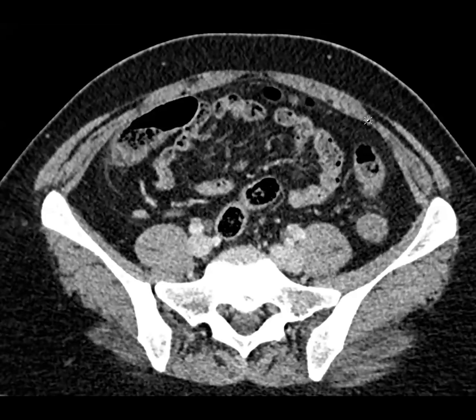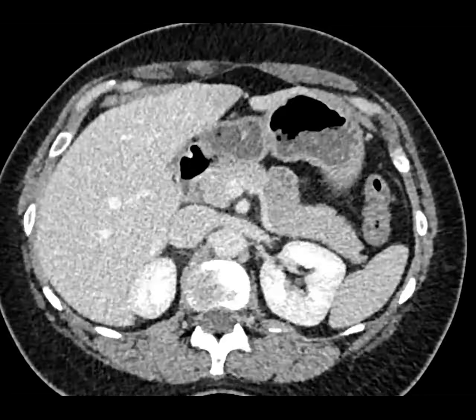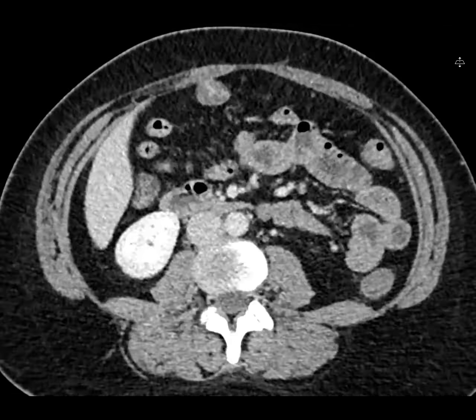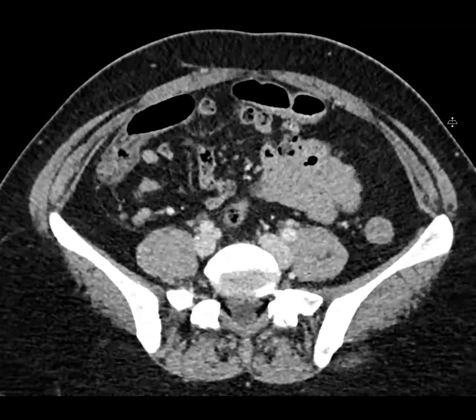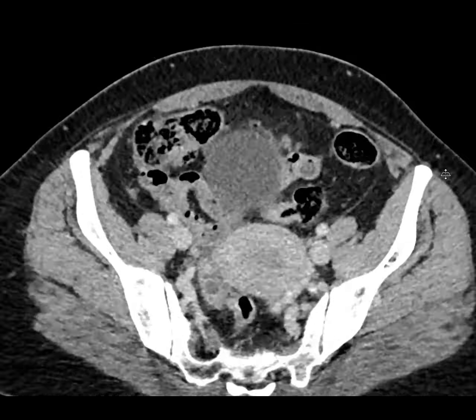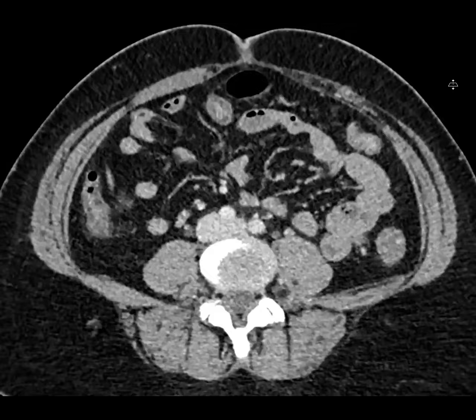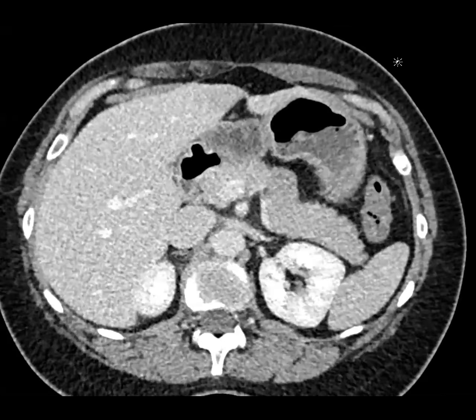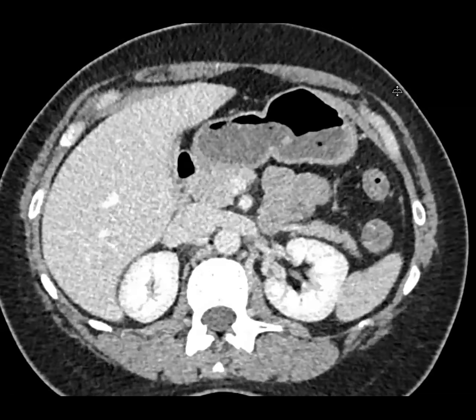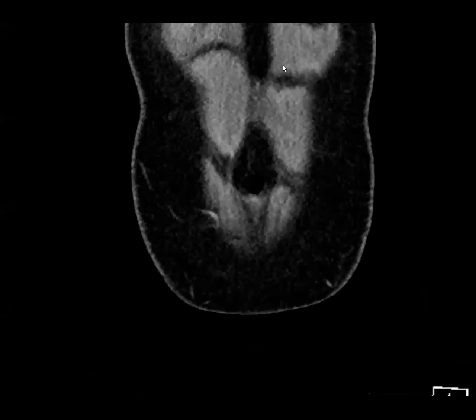Okay. This is a young female who presented with abdominal pain and bloody diarrhea. Focus on the colon. The left colon is thickened, and there's a lot of stranding. It's a pretty long segment, probably involving the splenic flexure too, like the watershed zones.